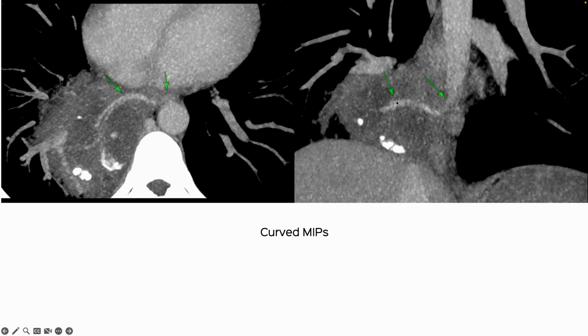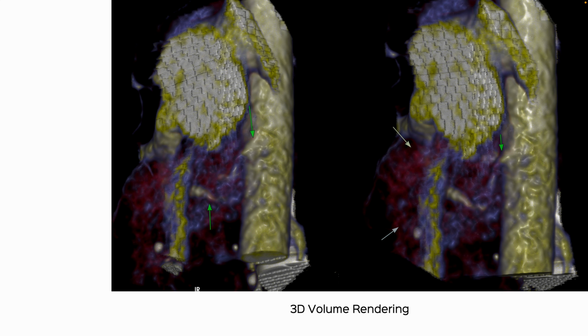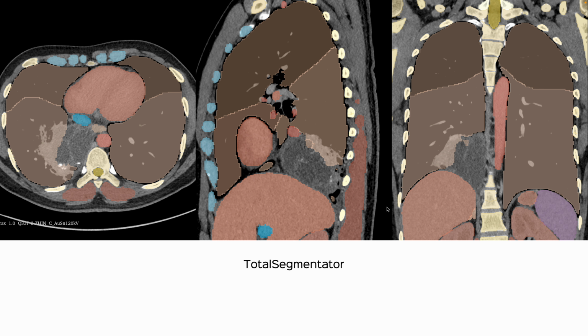So that does confirm the sequestration. I did want to show it in 3D, and I tried various combinations and landed up with this. That's the aorta and that's the vessel, and the red is the abnormal opacity in the lung. So that kind of shows that well.